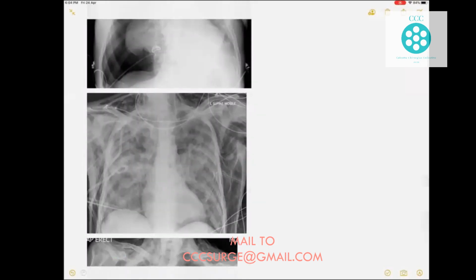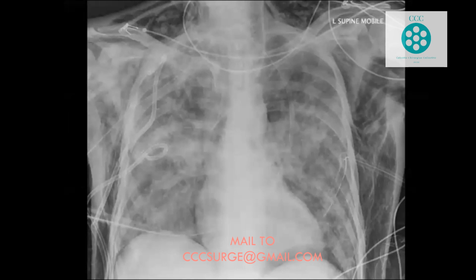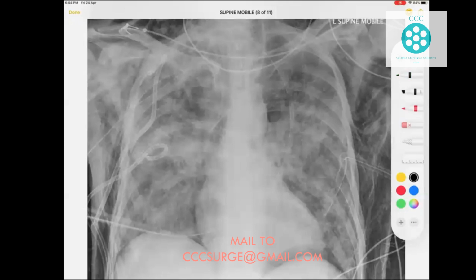Now, if you have understood that one, see another picture, again A, B, C, D, E. By this time, you know that something is very wrong. This patient has many tubes, sir, many tubes, holy God. But if you understand this systematically, one by one, what is this tube in the center, sir? The trachea. Does the A appear okay to you? Not very okay, but yes, I can see blackness around both. Maybe the lung has expanded, but there is something in the lungs.